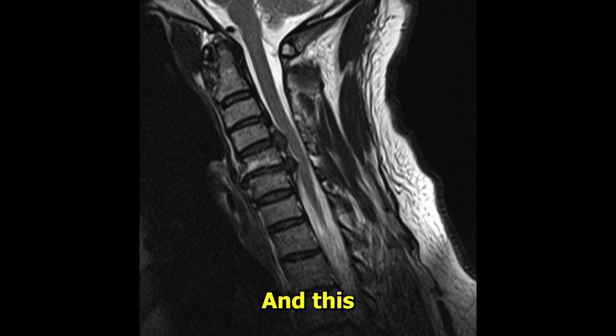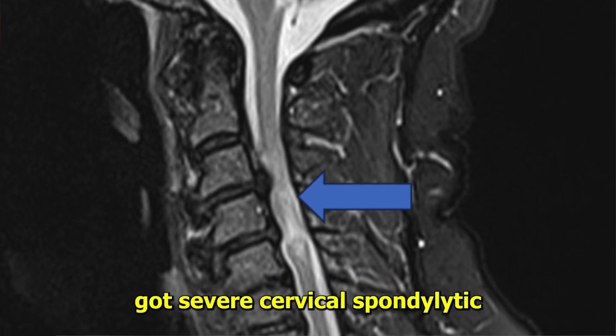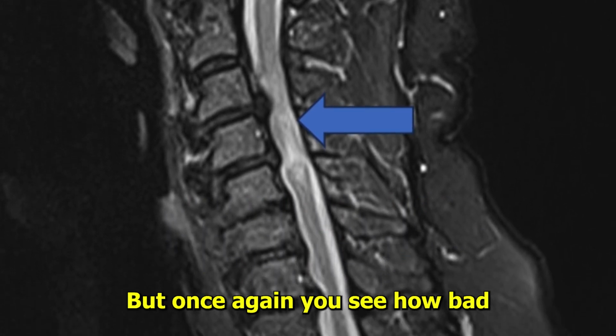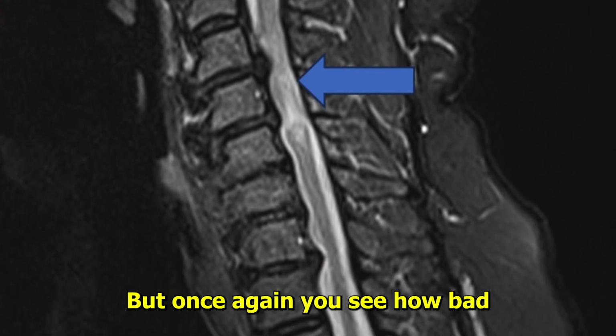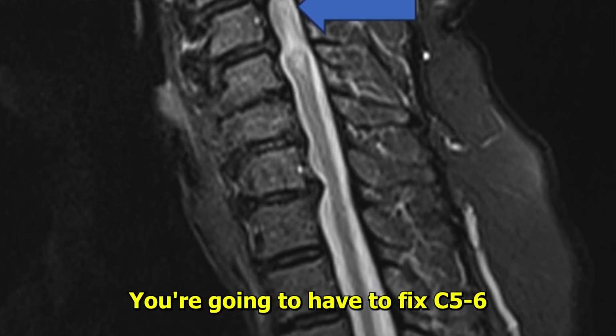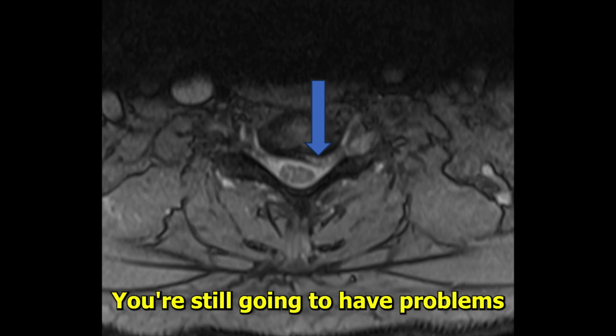And this needs 2-level fusion to decompress that disc. Here's another one that's got severe cervical spondylitic myeloradiculopathy. But once again, you see how bad the upper 5 levels are. You just can't fix this neck. You're going to have to fix C5-6, but you can't fix the whole thing. You're still going to have problems.